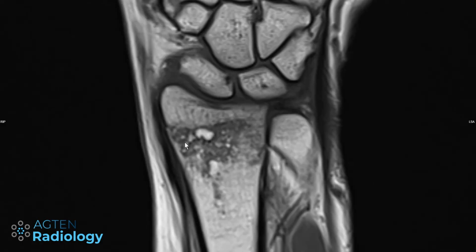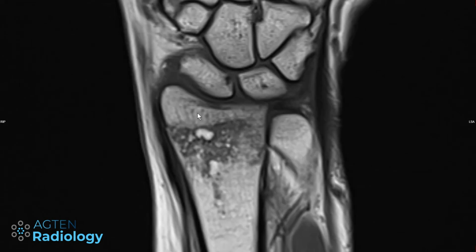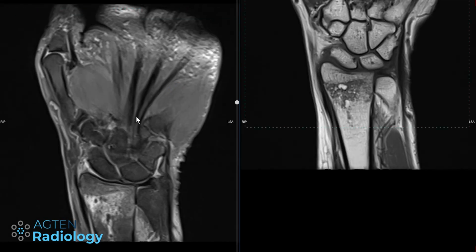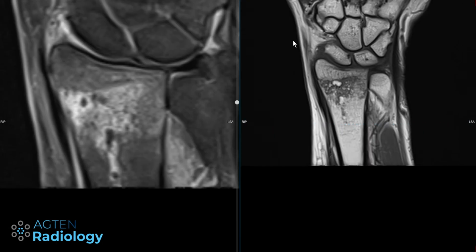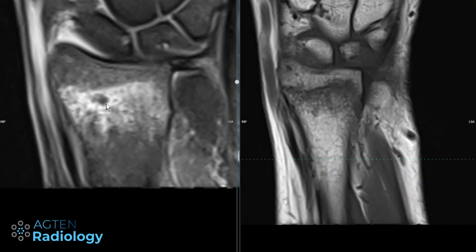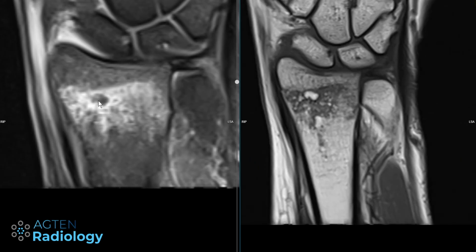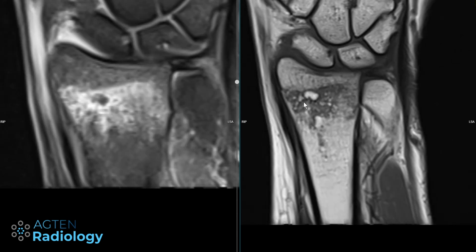But what about these hyperintense findings? We have these little dots here, a larger one there, that are just along the path of the fracture. What this actually is, we can also have a look at in the fat saturated proton density weighted sequence here. Let's zoom in a little and do a little correlation. In the fat suppressed images, this one here is hypointense, same is true for this dot here. So this is actually fat.